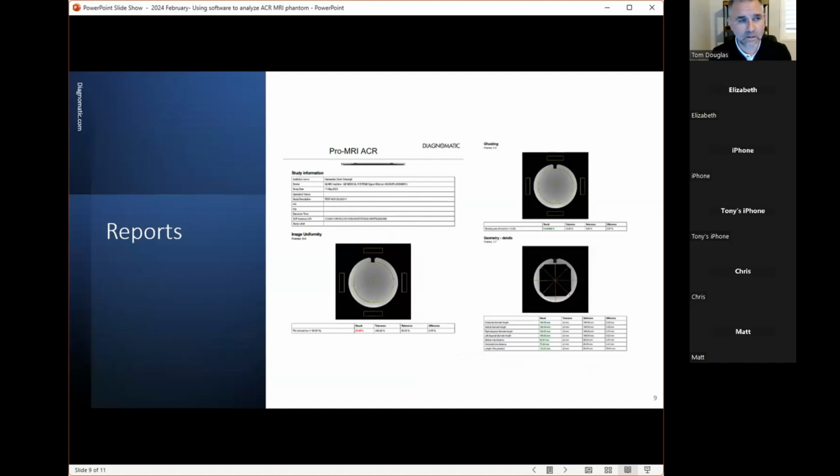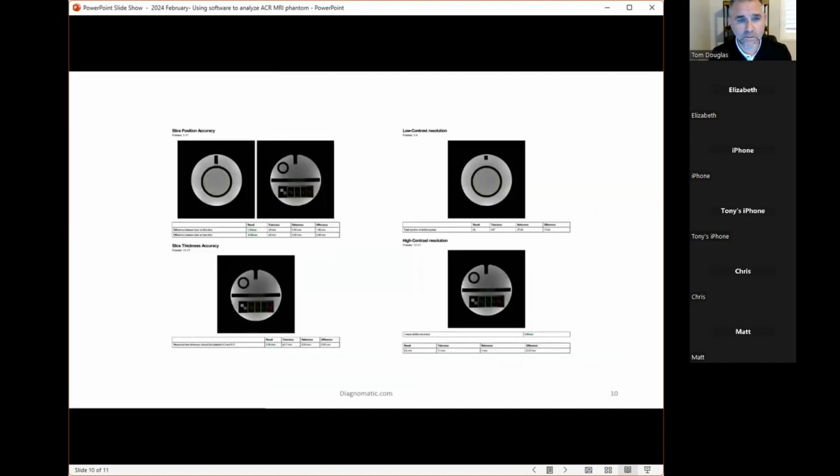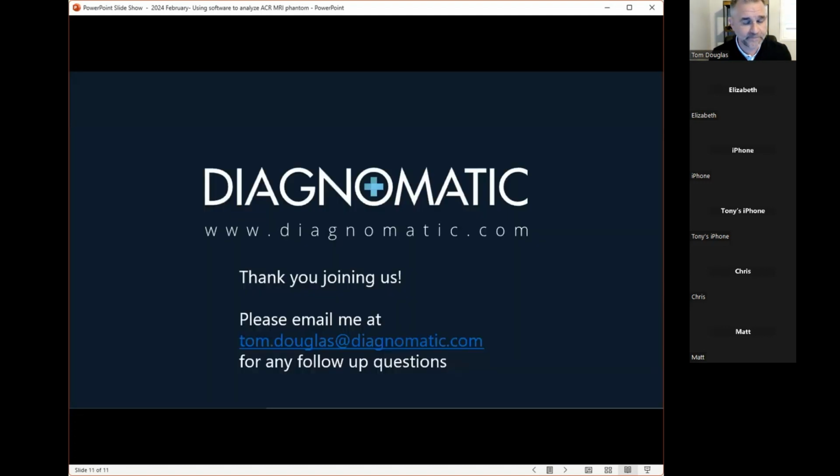Again, these are the reports which are going to get printed out.